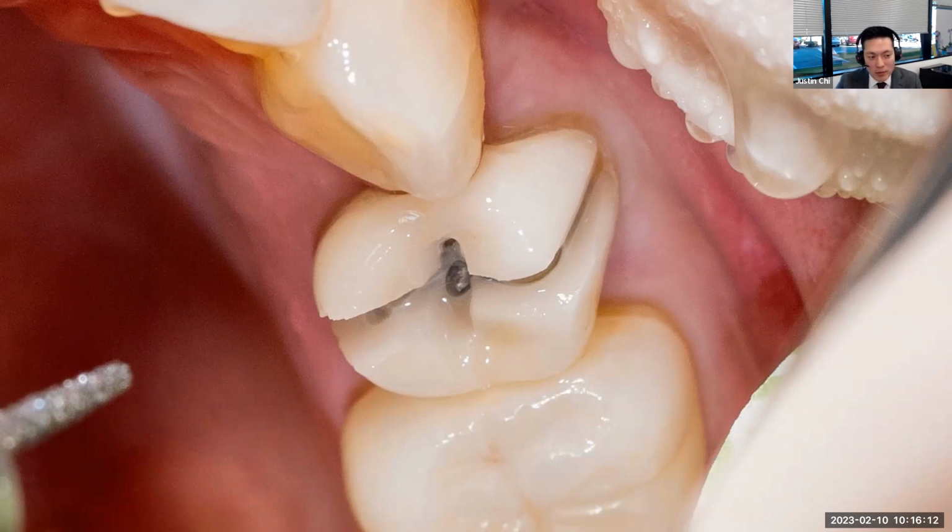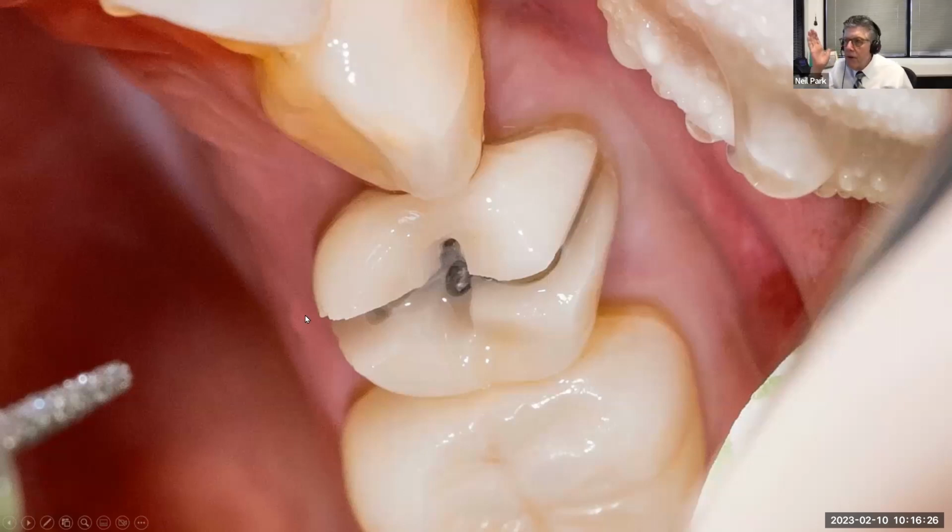It's probably one of those, which means at the shank it's 1.8 millimeters or 1.6, somewhere around there, but obviously it tapers down probably closer to 1.2, 1.3 at the tip. And do you make your grooves right to the tooth structure? Yes, I try to, definitely. Try to get down to the tooth structure so there's an easier chance of separation.